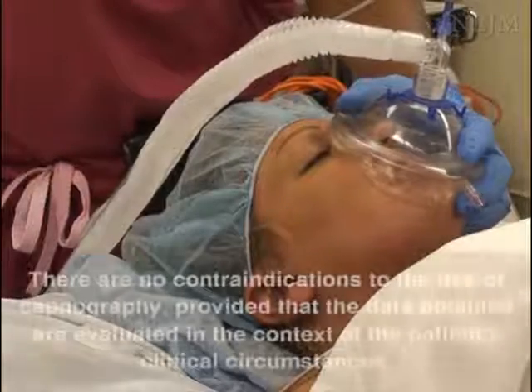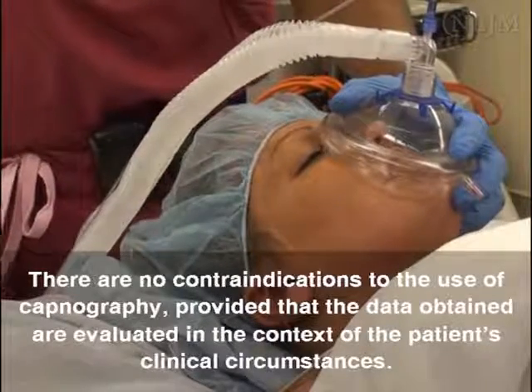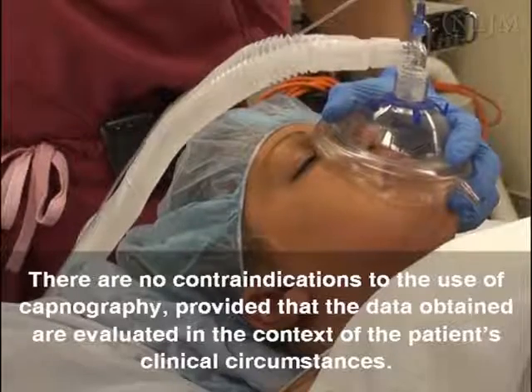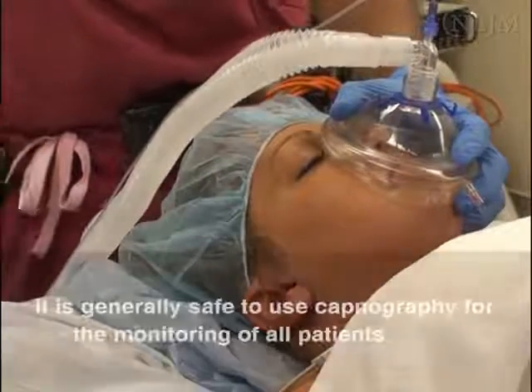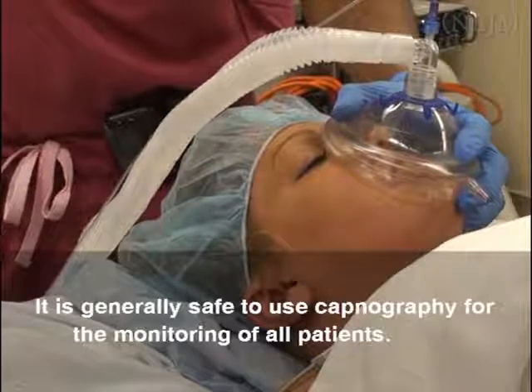Contraindications. There are no contraindications to the use of capnography, provided that the data obtained are evaluated in the context of the patient's clinical circumstances. It is generally safe to use capnography for the monitoring of all patients.